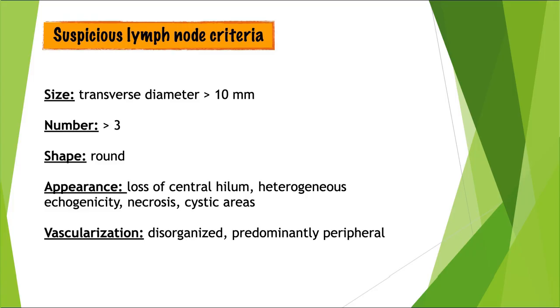Any suspicious criterion for a lymph node, even a single suspicious criterion, should prompt further investigations, either with additional imaging or even with a direct biopsy of the lymph node. But in any case, any criterion should lead to further exploration.